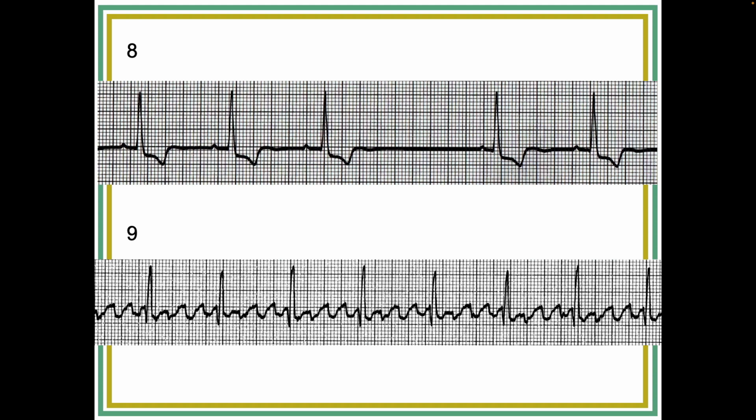Well, I understand the question, and I'm going to give you a little bit of a sloppy answer because I think the definition in and of itself is a little bit sloppy. It tends to vary a little, so it's a very good question, but like I said, it's kind of a sloppy answer. I reserve the term P wave for sinus P waves and atrial P waves like PACs, because it's a very distinct, singular entity that leads to the QRS. Today we're going to be talking about inverted P waves. I'll still call them inverted.